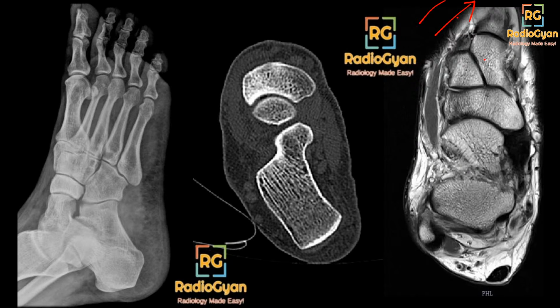Okay, so this is an adult patient. So Köhler's disease would typically be seen in a pediatric patient, but you have rightly pointed out the abnormality. So this navicular bone, if you see, is slightly more sclerotic as compared to the rest of the bones. And on the CT, you see this portion of the navicular bone, the lateral aspect is slightly smaller than the medial aspect and is more sclerotic. Sorry, the medial aspect is more sclerotic than the lateral. The same thing I'm trying to show here. So you see these areas of sclerosis.